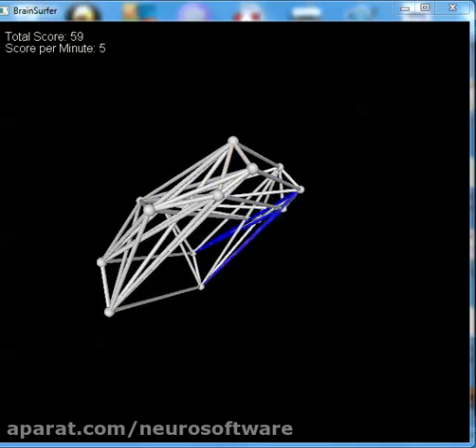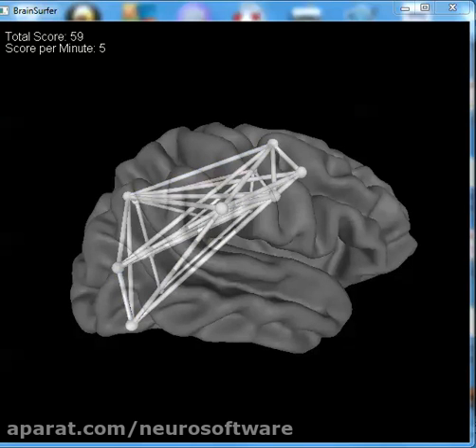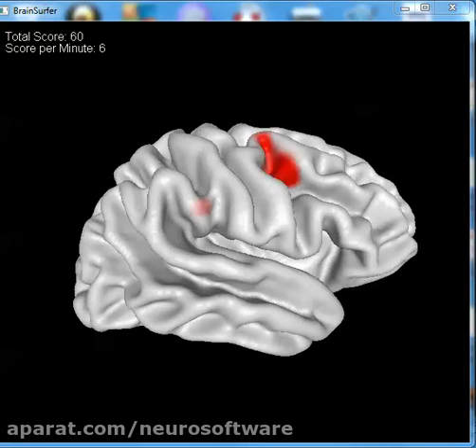Here we isolate the dorsal attention network by itself and bring back the brain if we wish, and also then go back to the surface to evaluate, again, the projection of the sources of the EEG onto the cortical surface. We can also select different networks in the brain, including the addiction network, the anxiety network, the default mode network, the mood network, pain network, pleasure network, schizophrenia network, working memory, the interconnectivity networks, Hagman hubs, and other networks that are available.